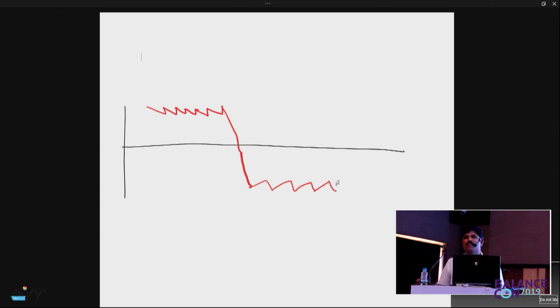What is this? What nystagmus is this? Here, where is the eye? Is it in the center, to the right or to the left? Right, because this is the 0 point. This is all to the right side. This is all to the left side of the center. So here the eye is looking at the right side and the nystagmus is right beating. Here the eye is looking to the left side and the nystagmus is left beating. So this is the typical gaze evoked nystagmus.